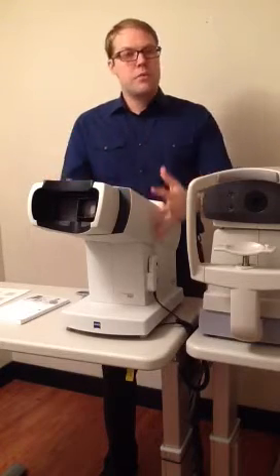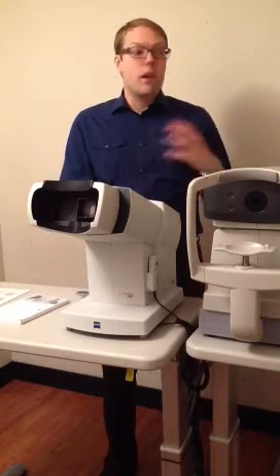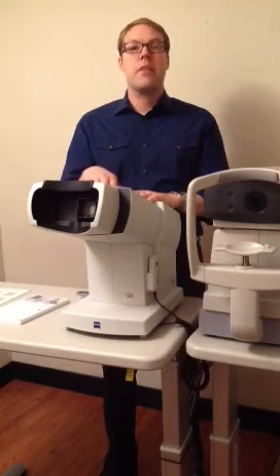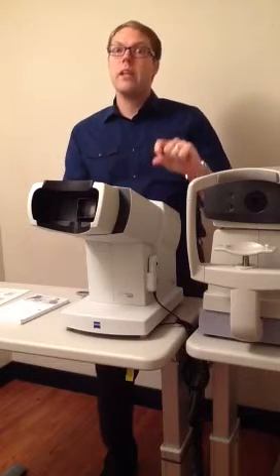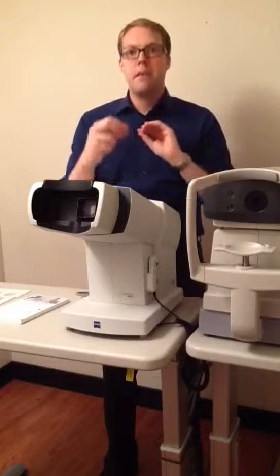So this is the visual field test. Dr. Thompson wants you to have this done today. It checks for lots of different eye diseases and disorders like glaucoma, diabetic retinopathy, retinal detachment, and lots more. And that's important because this machine can catch them in the very early stages. This is really key. We want to make sure we emphasize that this machine catches those things really early. And it's important that that is a separate point, right? Because you want each point to have its impact on the customer.